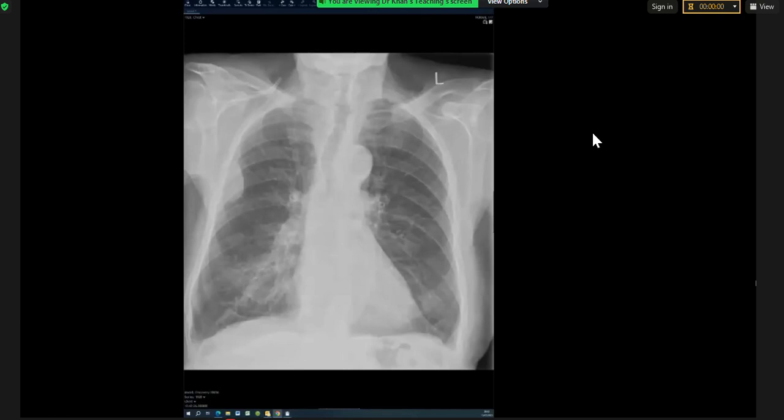But in miliary TB, you should not have tree and bud. In endobronchial spread of TB, you have tree and bud and all these nodules. When you have centrilobular nodules, that implies that there's something inside the airways. If that was TB, it wasn't miliary, it was endobronchial spread of TB.